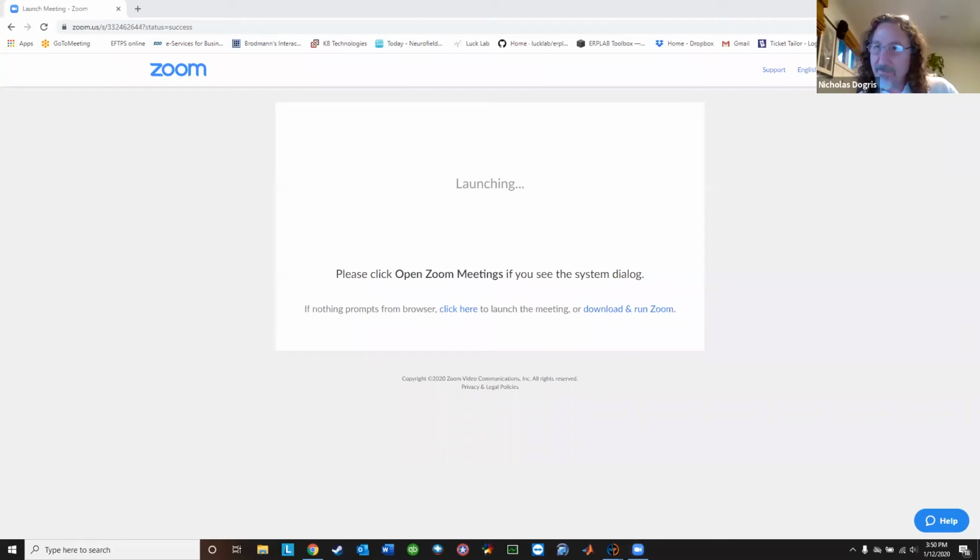Today we're going to cover the use of the NeuroField database and NICS database. So I'm going to share my screen here, and let's just jump right in.